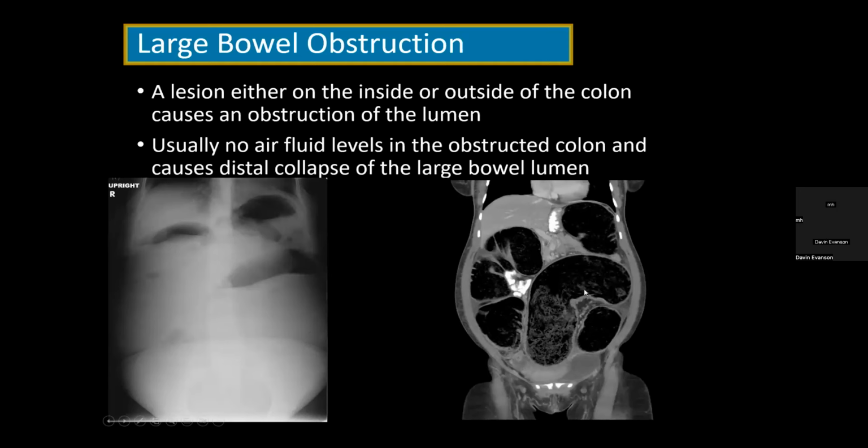Again, there's stool in there. That looks like large bowel to me. No rectal gas. I'm thinking large bowel obstruction. We'll come up with a differential for this.